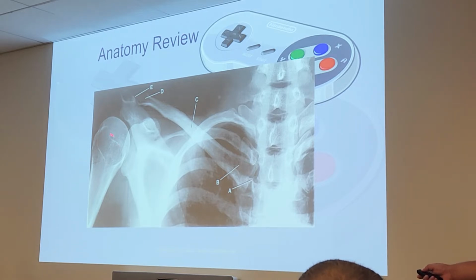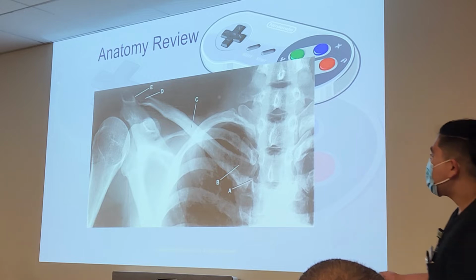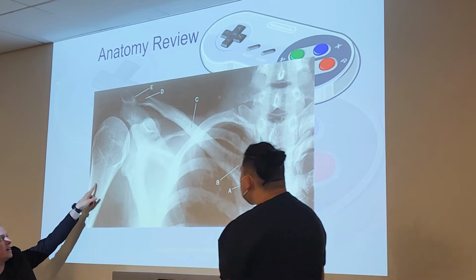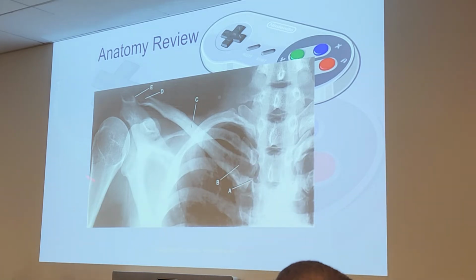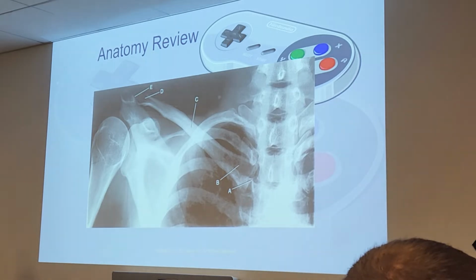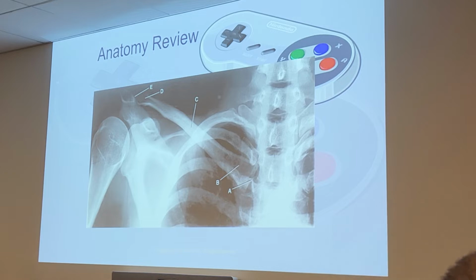Right here, the anatomical neck. Can we see the surgical neck right there? What you're seeing there is just an outline, a portion of the head, what you're seeing through the ball. So where's the anatomical neck? Do you see how this is the anatomical neck?